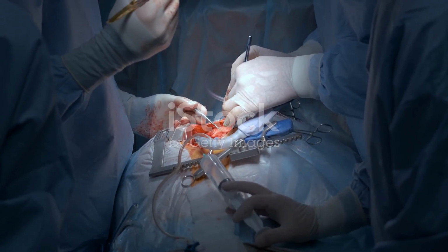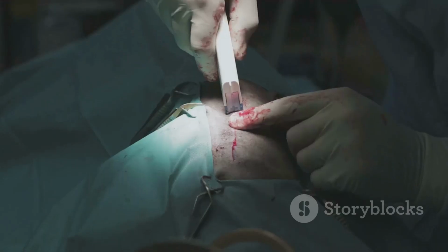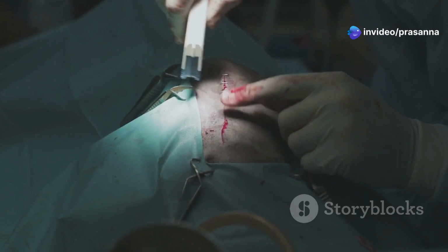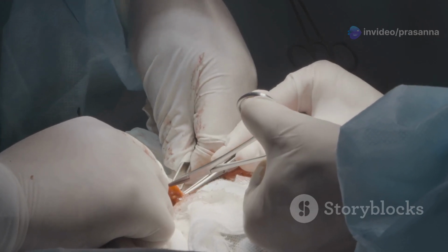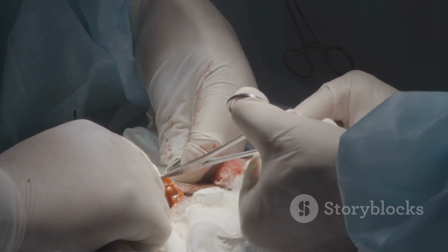Section 6. Tying up loose ends, suturing instruments and wound closure. Once the surgical procedure is complete, it's time to close the incision or wound. Suturing instruments are specifically designed for this purpose, enabling surgeons to meticulously stitch tissues back together.